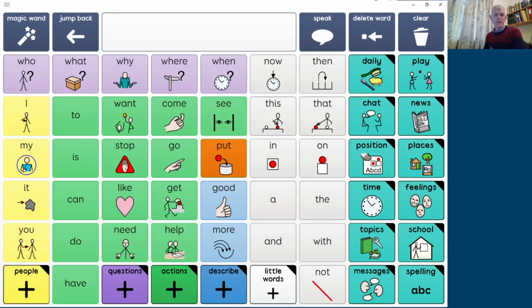Okay, finally in this section, I just want to have a quick look at one final way of scanning with something called a switch joystick on this occasion. So what I have next to me is what looks like a fairly ordinary looking joystick. This is made by Praetorian and it's their new Jazz joystick, which is coming out soon. And although it looks like any other joystick, it's actually both a mouse joystick, a normal movement joystick, but can also be used as a switch joystick. So what does that mean?